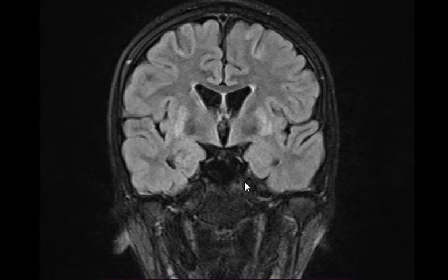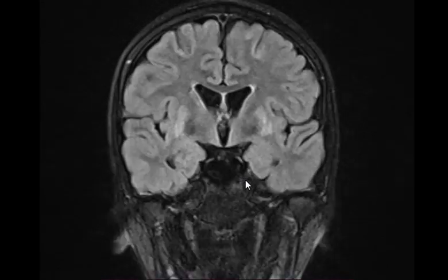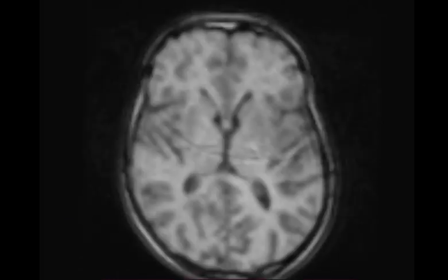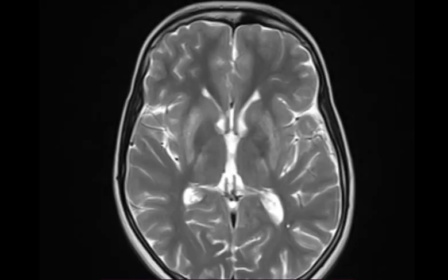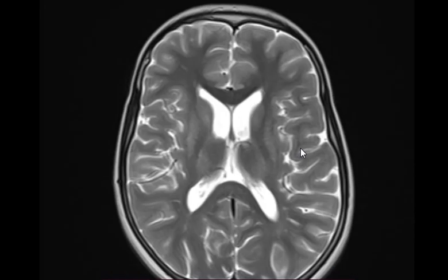Okay, a little bit increased periventricular signal on FLAIR images. Let's see the axial T2. What do you say? Yeah, good. Take the axial T2. Let's have a quick look on what's going on. Is this a box-shaped ventricle? It can't be two Huntington cases one after the other. It's too much.